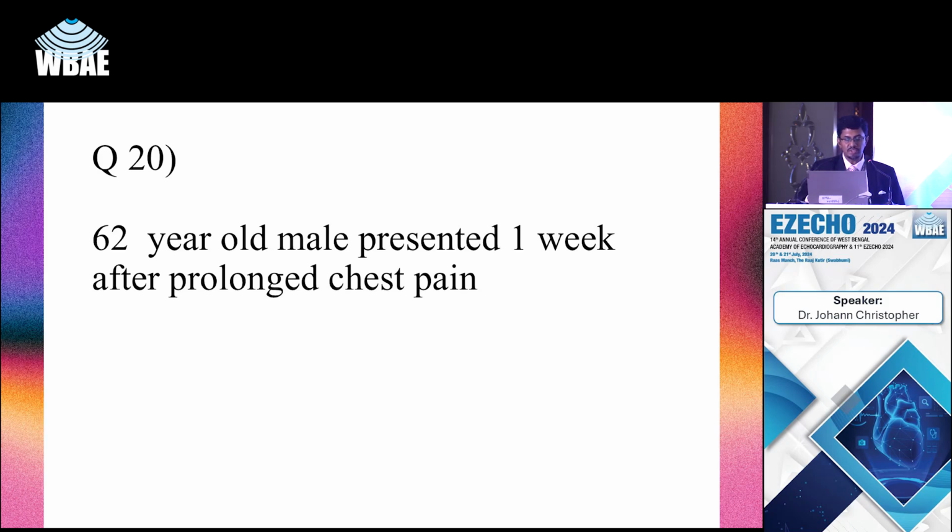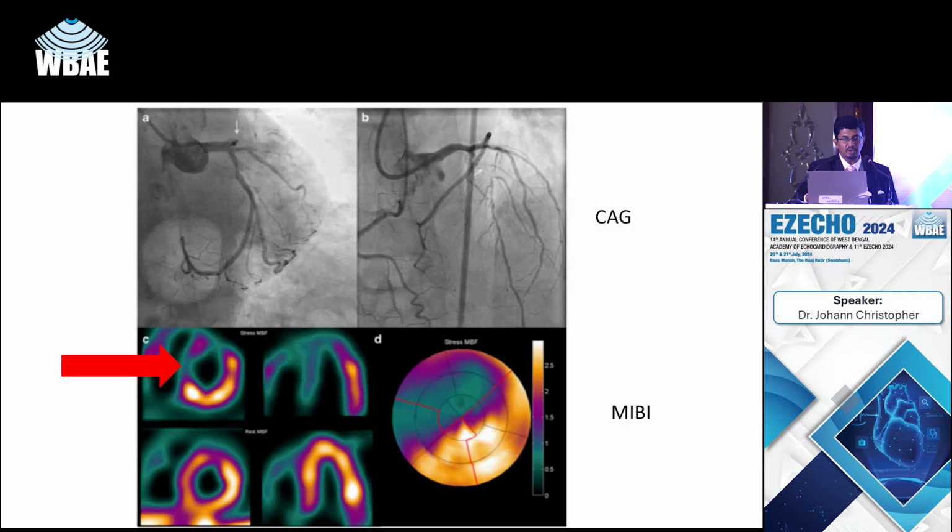The answer, of course, is C, extrinsic compression, stomach herniation. And 18, I think all of you got. This is nothing but apical HCM, very clear, spade-like LV cavity. That's the very thick apex, dilated left atrium. I've not showed you any other images, so EMF will not be part of this. And there's no LVOT obstruction, so there's no obstruction at all.